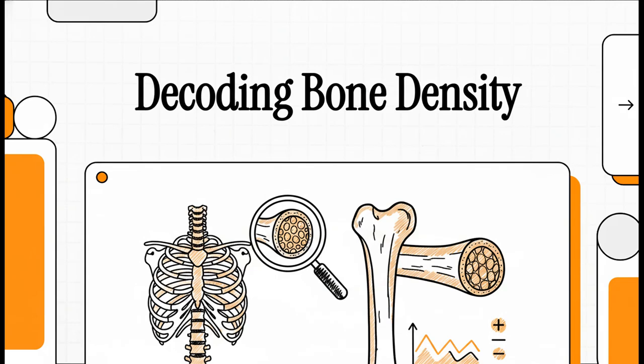I am so pumped to have you here today because we're going on a hands-on guided radiologist tour. We're going to completely bypass all that dense medical jargon and look straight at the evidence. We're talking about bone density today, and specifically, we're going to learn how to actually read the hidden language of our skeletal system using real diagnostic imagery. Let's just jump right into it.